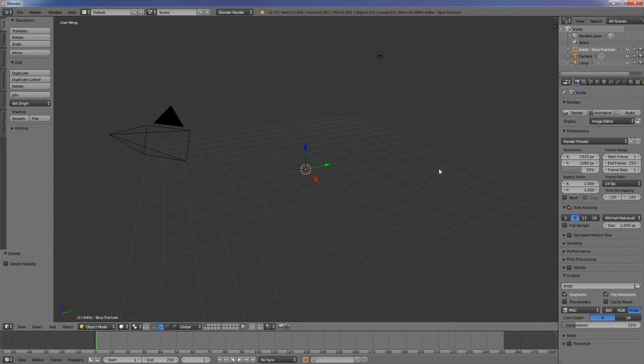we don't see it. One of the things you have to remember with Blender is that Blender measures distance with an arbitrary unit called a Blender unit. And on the default grid, each one of these small squares represents one Blender unit. Our file is in millimeters, and when Blender imports it, it converts 1 millimeter to 1 Blender unit.